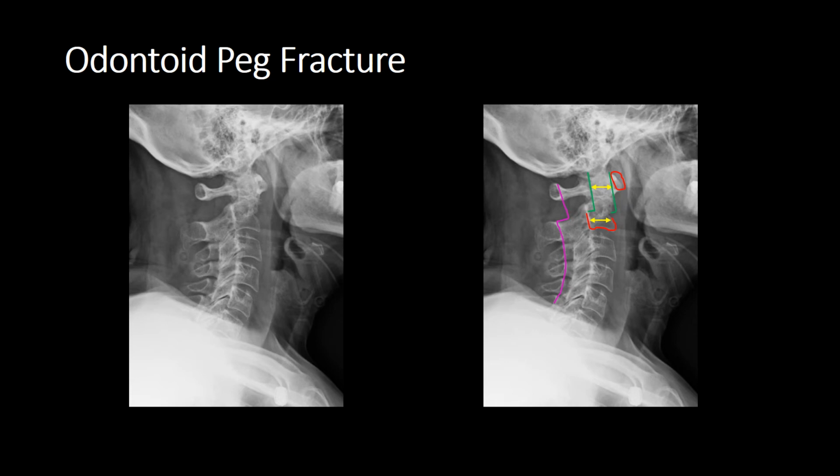Okay, let's do the proper assessment. A is for adequate. Okay, we've got the base of the skull on. It was really helpful. We've got the clivus, which is fantastic. We can bring the clivus down and see if it meets with the posterior cortex of the odontoid peg, which it does. 1, 2, 3, 4, 5, 6. So clinically, this is inadequate because we need to see T1. In the exam context though, this is fine.